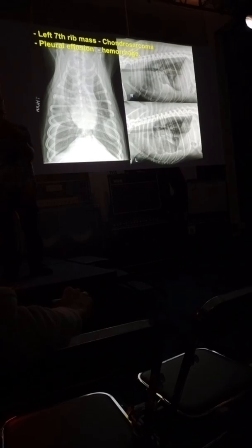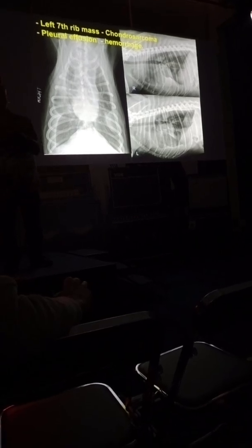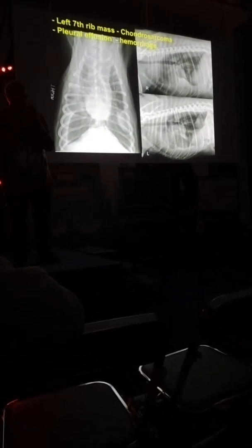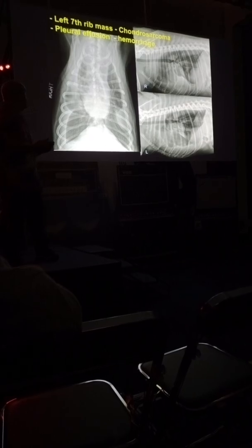Now, if you went and tapped the effusion, did a thoracocentesis and came back and re-radiographed it, I bet you'd see it better. But this is where being systematic is so important.